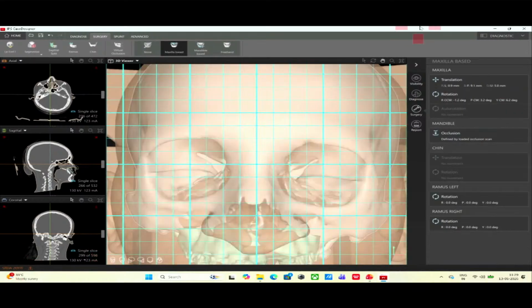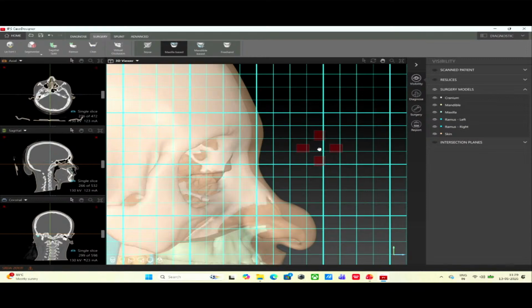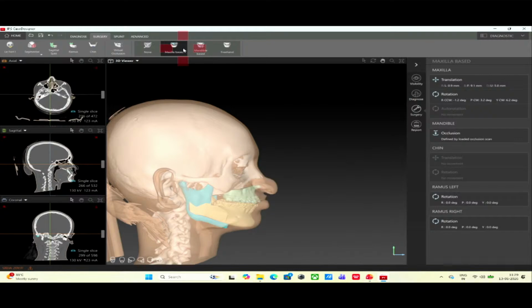And the final movement. Of course, I didn't do the proper planning now, but if you're happy with the planning, you can have a look at it. Right, so this is the initial situation, and this is the situation that we have planned quickly. Okay, later you can play around in the afternoon.